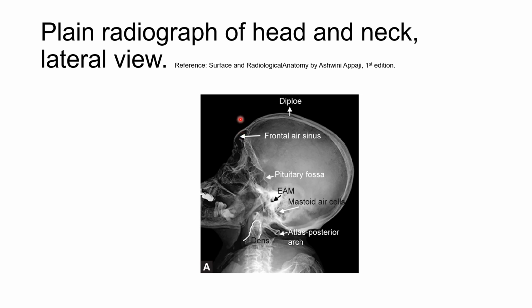And also you can see the skull cap. You can see, you know what this is? This is the dens. So which cervical vertebra has this structure called dens? You should study and know the osteology before coming for the viva of radiology of anatomy. So it is all connected, students. First you learn the osteology properly.